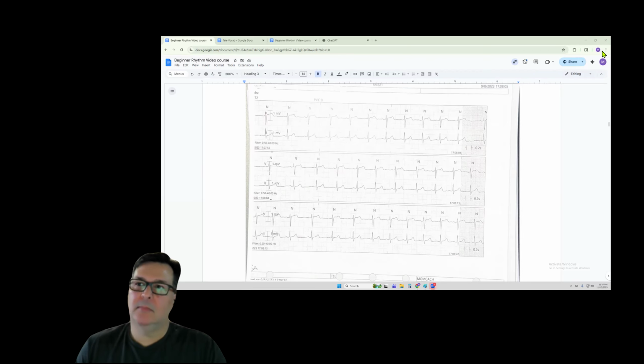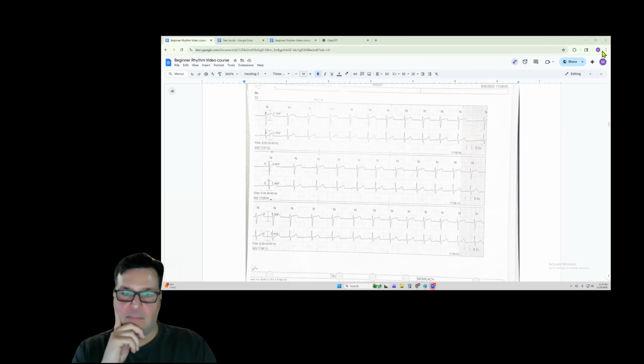Like this one that Jeff has on the screen, you can see just looking at it without measuring it that there's a difference versus somebody whose heart rate is 60 and you might find a minuscule difference in the R to R. That's still going to be a sinus rhythm, not sinus arrhythmia. Because you can have a heart rate fluctuation, right? Nobody ever stays perfectly at 70. But with sinus arrhythmia, it's going to be quite obvious. It's going to be like a jump, like 60s to 70s, like I was saying. And looking at that screen, it's obvious.